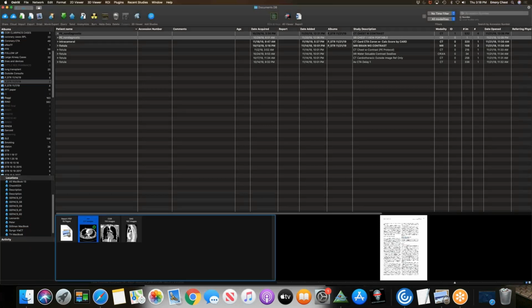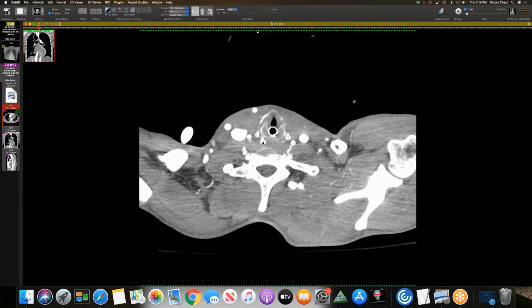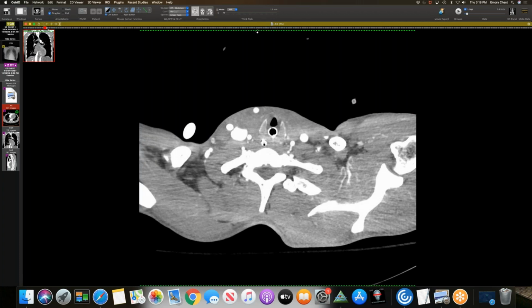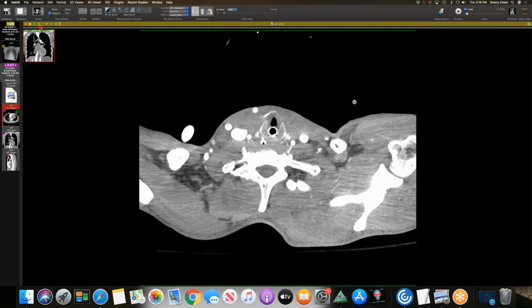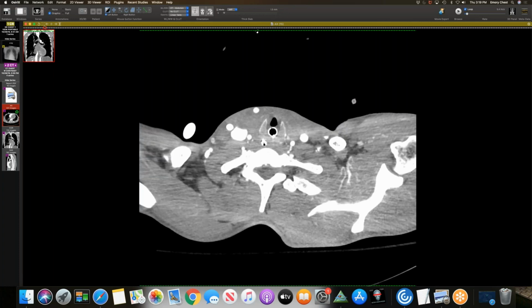Yeah. Okay. So my first case is a 34-year-old patient that came in with respiratory failure. He had an acute asthma exacerbation. He got admitted to the ICU. They put him on veno-venous ECMO, and then he developed cardiac arrest, and they had to switch him to VA ECMO. And so for some unknown reason, the team ordered this chest CT protocol after he was already on VA ECMO. And I found it really interesting just because it kind of highlights the hemodynamics of VA ECMO.